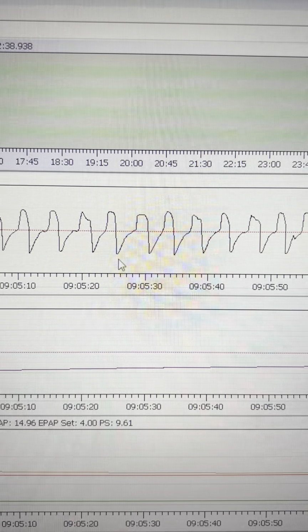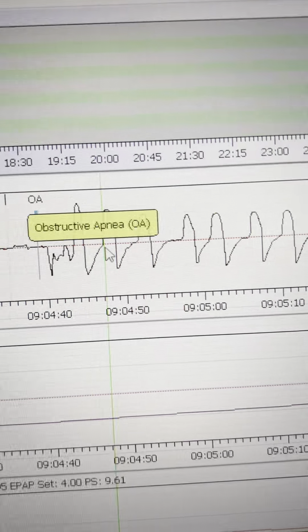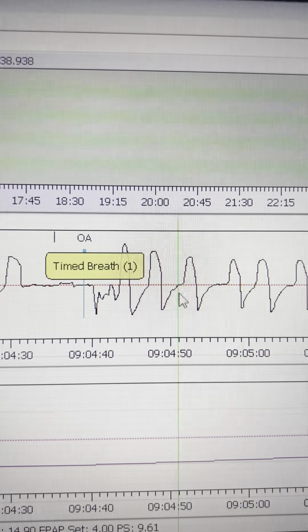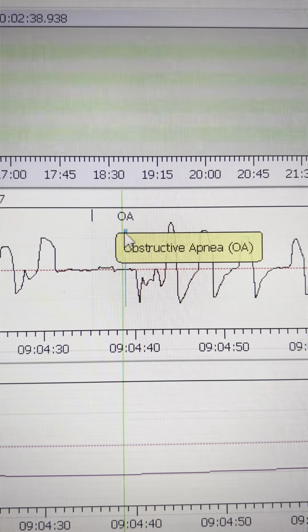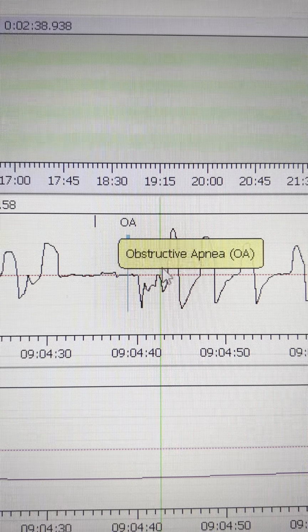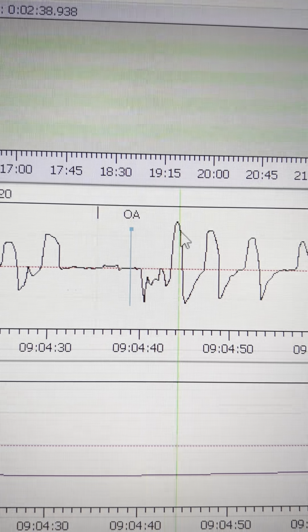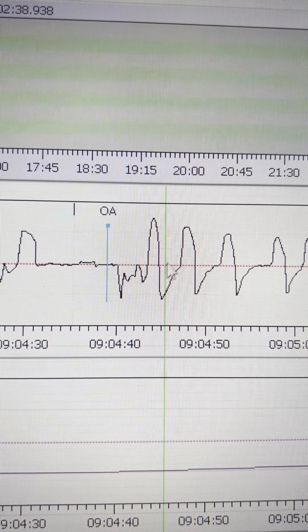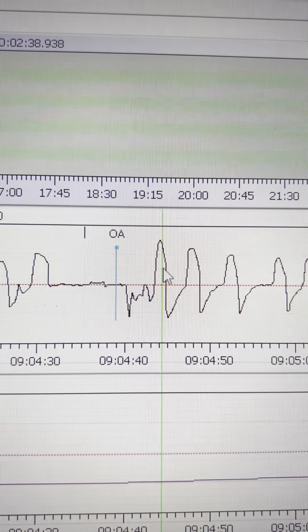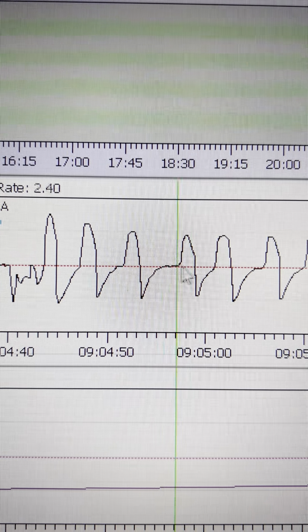And I calm down quickly. So normally, if your O2 is too high, I would say that you would be seeing a lot of centrals after here. So you should look out for that. Like if you're getting some kind of obstruction, then a peak in for like recovery breath, so you get a lot of oxygen in, and then your body doesn't know what to do with it that much. It wants to make it more neutral because you gasped in too much maybe, and then you start seeing a lot of centrals here.